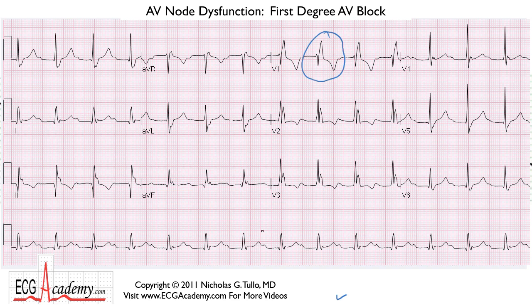If you scan across, you see that the QRS complexes are quite regular at a rate of about 300, 150, 100, 75. It's somewhere between 100 and 75, closer to 75. I'd call it about 85 beats per minute. And where is the P wave? If you look in front of the QRS complex, you really don't see a good P wave there. But keep looking, because here it is.